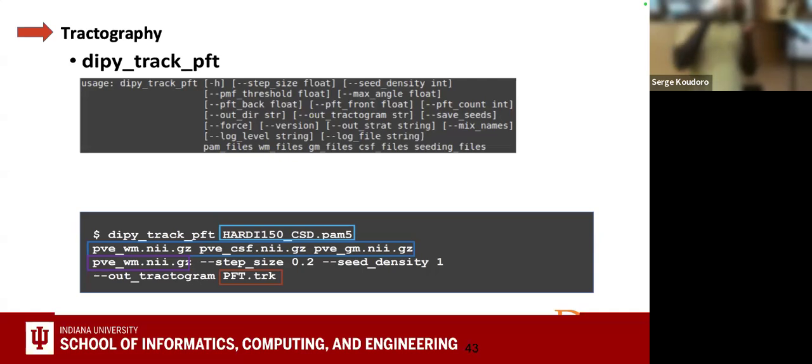And then stop, backtrack, continue, and backtrack multiple times to see up to which point you can get. So this is a nice technique, and it can actually be combined with all the other techniques where you choose a direction, but this one backtracks. That's why this command will disappear, since it can be combined with all the other methods. Now it's just used with only one method, which is problematic.